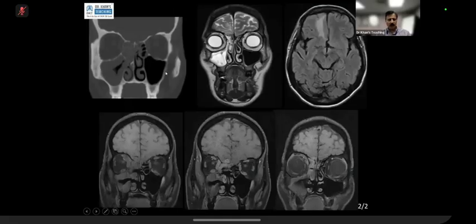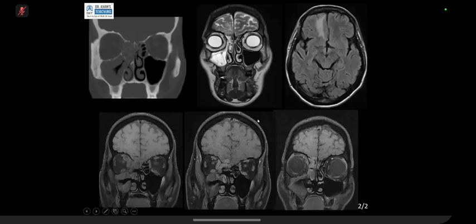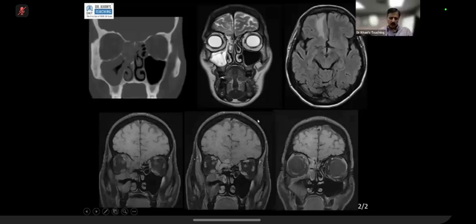So what we did was, we were worried something is happening. We did an MR. And candidate 2, you are going to tell me the findings on this MR. On this MR, this is a T2 weighted sequence. This is a FLAIR of the brain. This is pre-contrast fat saturated, post-contrast fat saturated, post-contrast fat saturated. Candidate 2, what has happened? There is a FLAIR hyperintensity in the adjacent right frontal lobe. So this could have extended intracranial through the cribriform plate. Right. So this is the type of case which you are expecting in the exam.